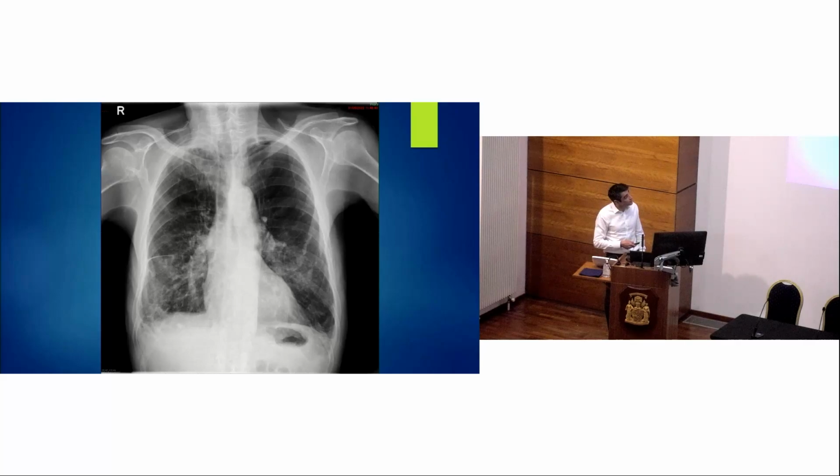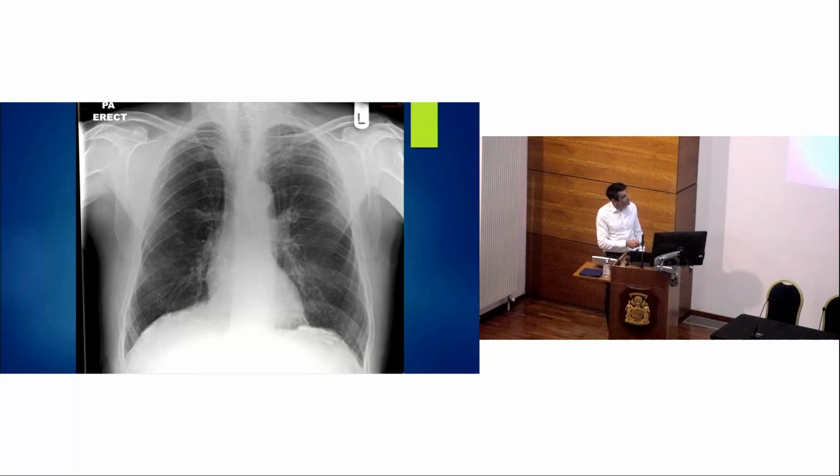And this is what they look like in chest x-rays. So see this bright white line here, and here, and here. These are calcified pleural plaques, and they tend to run along the line of the rib very characteristically. Or in this next example, we can see them outlining the hemidiaphragm, bright white lines. And this is the calcium of the asbestos-related pleural plaque that lets us know that this person has been exposed to asbestos, and we should be thinking about other asbestos-related diseases, in particular mesothelioma.